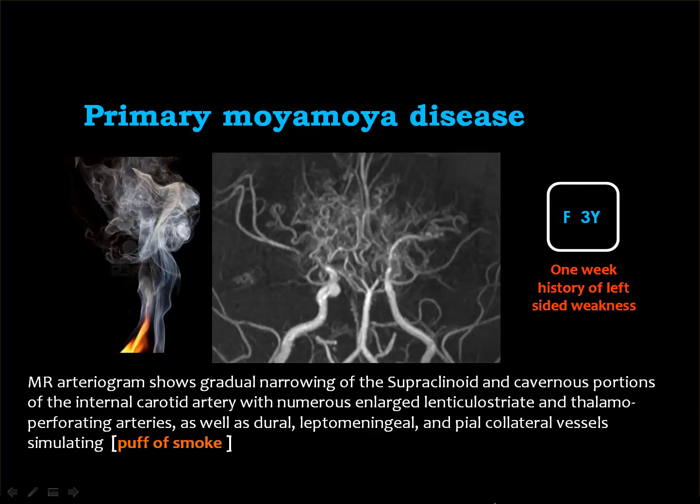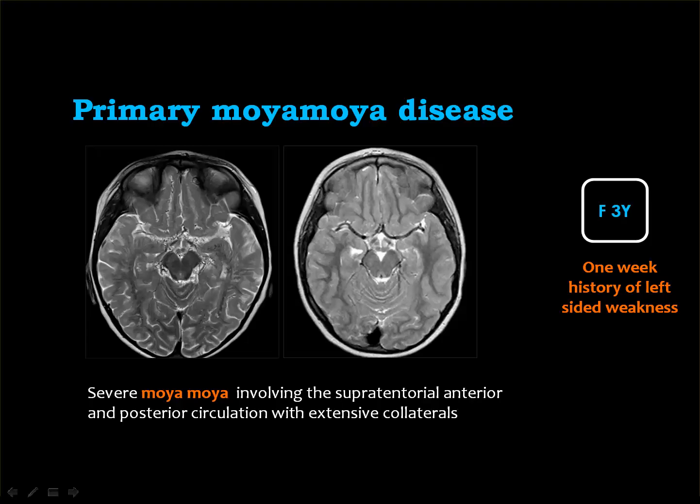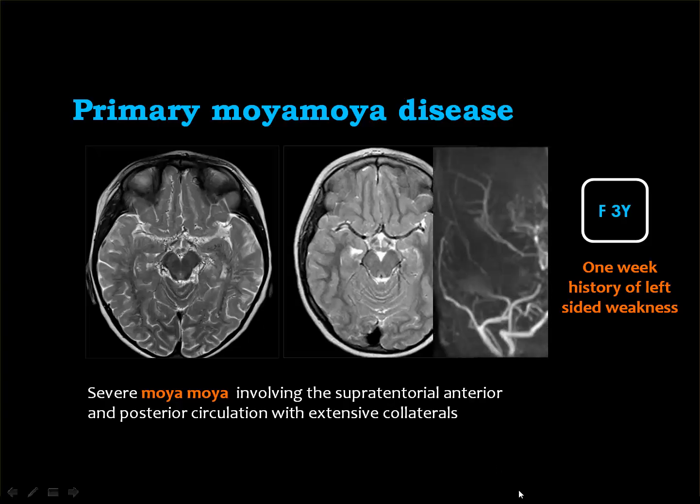Then frequently in the exam, you are confronted by this image, and you are looking carefully throughout the brain parenchyma, through the suprasellar area, looking for a certain pathology, but you do not see. The clue is in the suprasellar cistern, where you see extensive, numerous, very minute vessels instead of the middle and anterior cerebral arteries. Then you know that you are dealing with Moya-Moya disease.